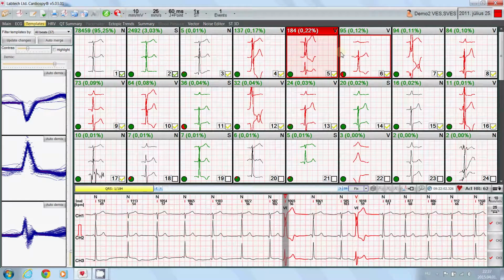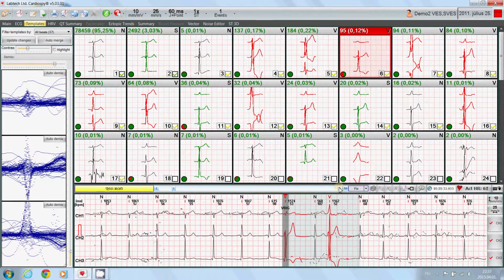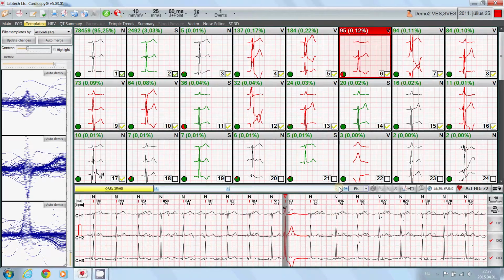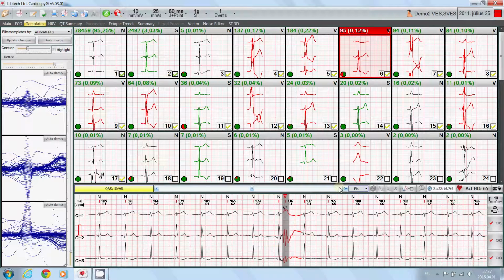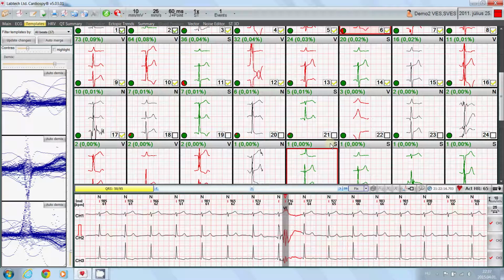The fifth one looks okay, just like the sixth, which is mostly okay, however it contains lots of noisy beats, which normally you would want to fix, but I will not do it in this case, because I've already shown you how to do this. I will just skip the other templates and get to those with a very small number of beats.